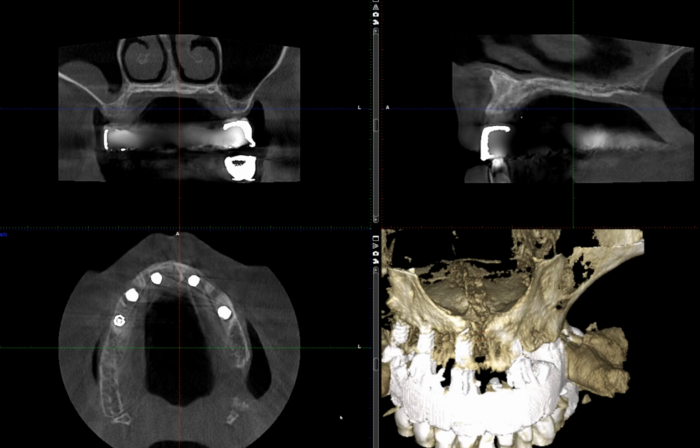This has also been referred to as antral pseudocyst, antral cyst, mucous retention cyst. So just keep that in mind. These can be referred to using different terminologies depending on where you practice and how you're trained.